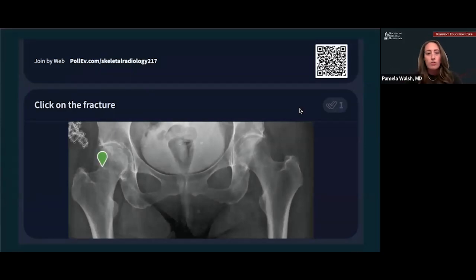Let's see, is there a fracture here? If so, okay, click on it. You guys are awesome. Okay.